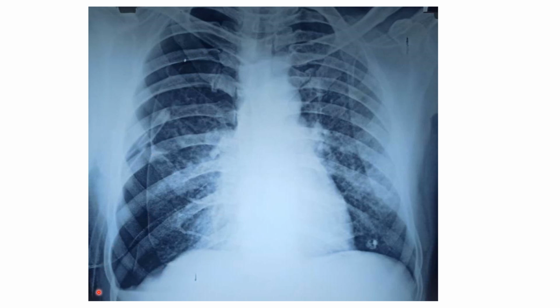And this X-ray is post-treatment. Here you can identify an intercostal drainage tube. If you follow this, there are two parallel lines up here, right? And there is some hollow sort of thing in the tube, two parallel lines coming out into the thorax, right? So this is the ICD. This is post ICD insertion.